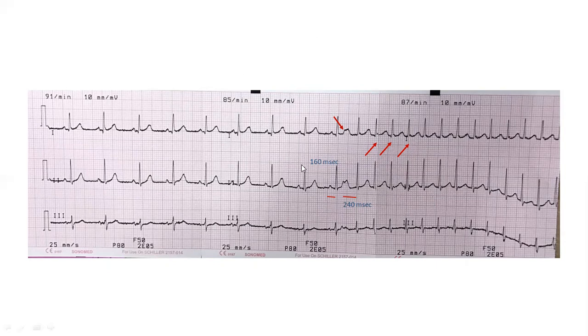Since you have an onset here, that will help you कि ये कैसे on हो रहा है. क्या ये wobble के साथ हो रहा है? क्या QRS की morphology change होके हो रहा है? या PR की change के साथ आ रहा है? So if you look at this, साइनस के अंदर PR शॉर्ट है. ये एक एक्टोपिक बीट आई है जिसको लॉन्ग PR के साथ कंडक्ट किया और टैकीकार्डिया स्टार्ट हुआ. So this onset gives you one clue.